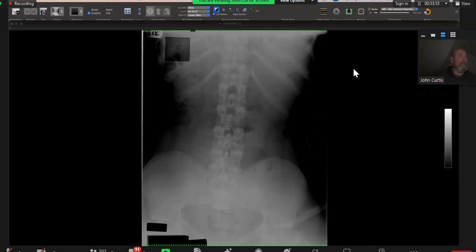I can see that the vertebrae appear normal. There is no evidence of fracture. There is preserved alignment. There is no abnormality seen within the ribs. Put it all together, my top differential diagnosis for this case is achondroplasia. Yeah, good. So I will ask for the rest of the images to see if there is any other associated finding. Okay.